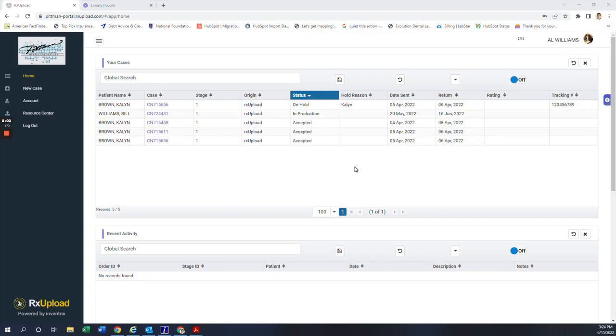Hi everyone. In our second video, we're going to talk about RxUpload and how to submit a new case. So here you've logged into RxUpload. You're greeted with your list of cases that you currently submitted. And so now we're going to go over here to the menu on this side and click New Case.